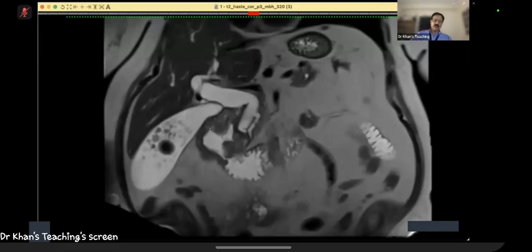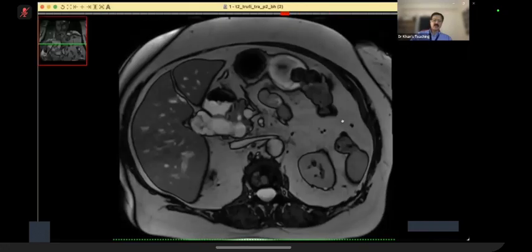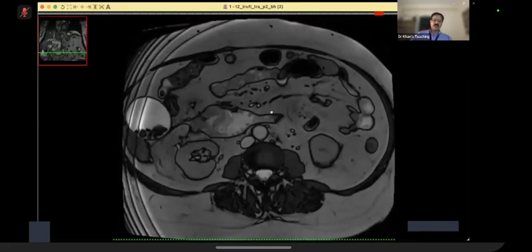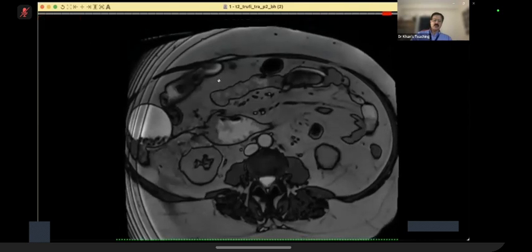This is a thickened, fungating type of ulcer mass. And part of the mass, of course, is invading here. And then on an axial sequence, which is this one, we can see the same thing. Now, the key point is: develop your eyes for anatomy, where we are in this region.